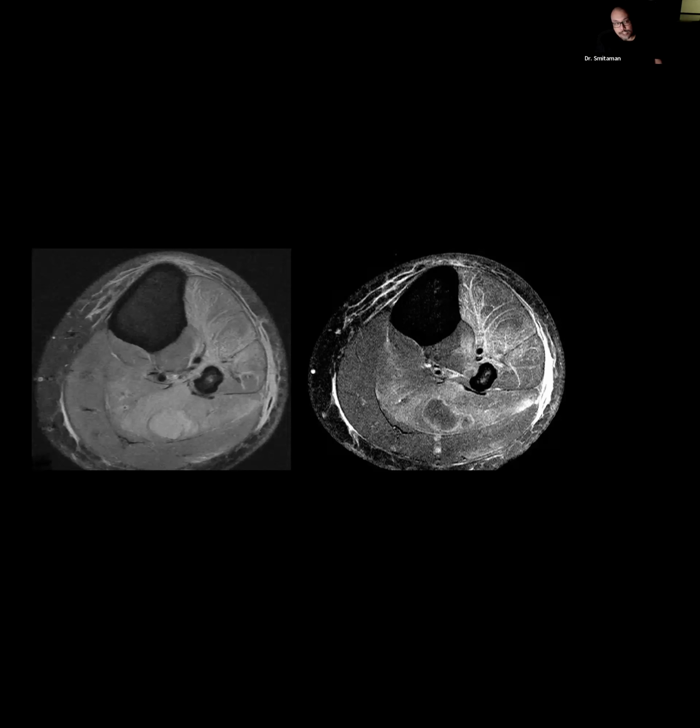Pyomyositis, okay, continuing along this theme, is usually identified by large areas of non-enhancement, as we can see here in the soleus muscle proximally. Okay, this T2 weighted sequence obviously shows the pus within this abscess, but you may see sometimes intralesional gas as susceptibility artifact, or T1 and T2 foci of dark signal. And sometimes on T1, we MSK radiologists love to talk about the penumbra sign, which is basically a thin rim of increased T1 signal within these infectious lesions.